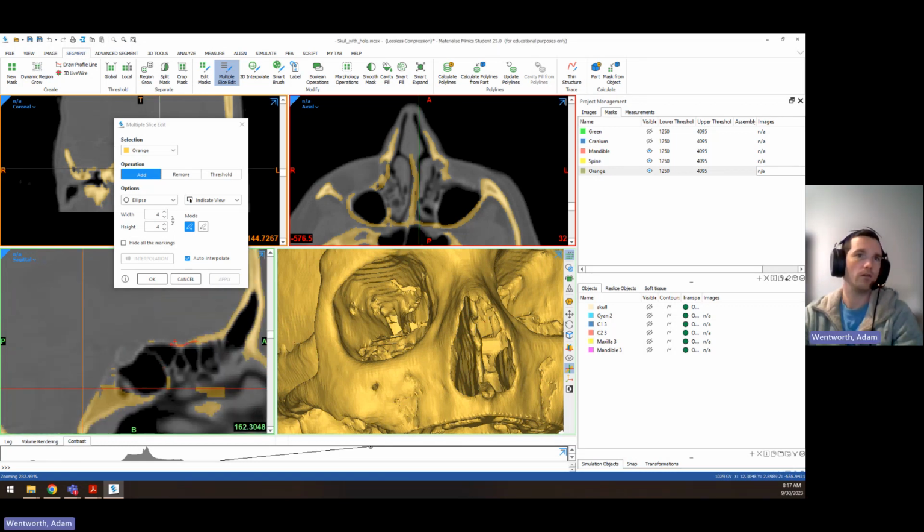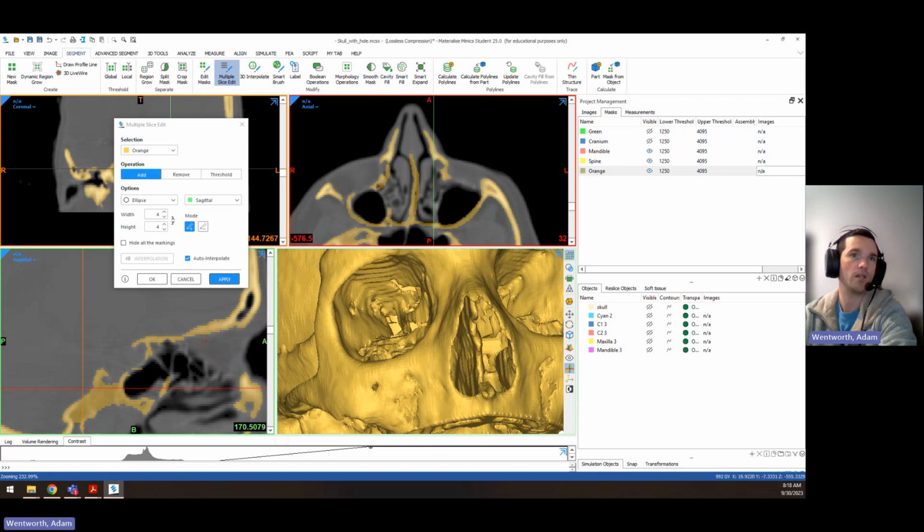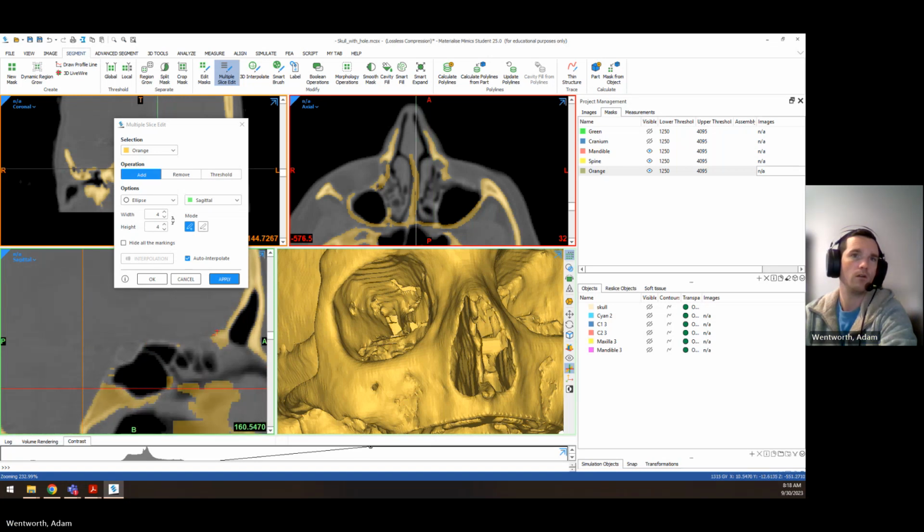Here's another thin area of the skull, the cribriform plate, which is above and next to all your sinuses; the ethmoid sinus and sphenoid sinus are up here. The cribriform plate is right in the middle of the nose, and so your olfactory nerves go up there. But this is all the solid wall.